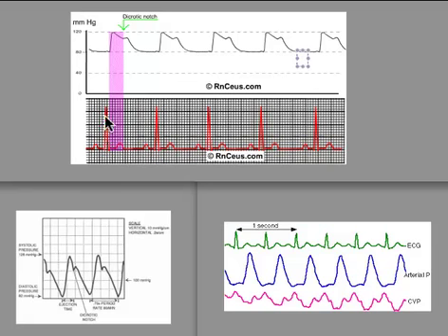So you'll notice the EKG here, the QRS complex, of course, represents the beginning of ventricular contraction. So of course you're measuring arterial blood pressures instantaneously. So these are more or less equivalent to a blood pressure that you might get with a cuff on someone's arm, but you get it beat by beat.